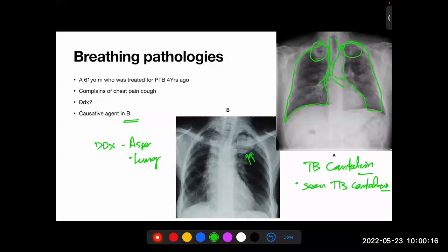But then here you correlate with clinical findings. Of course, diagnosis of aspergilloma is histological. You have to stain the fungus and say, oh, this is Aspergillus. But in a patient who is post-TB complaining of chest pain, sometimes with hemoptysis, and you do a chest X-ray and find something like this, I can argue it's aspergilloma, but there's no other more specific diagnosis. Is that helpful at all?